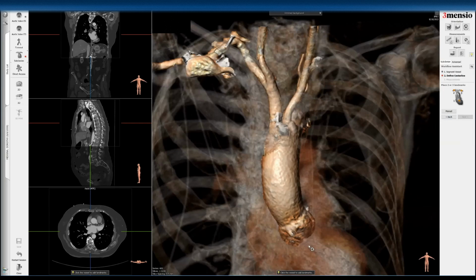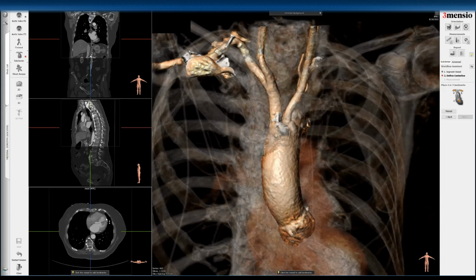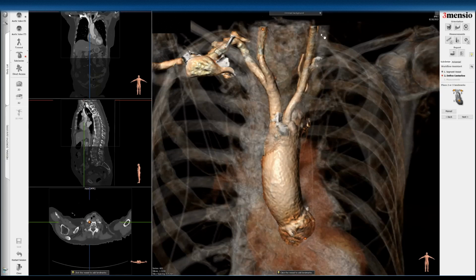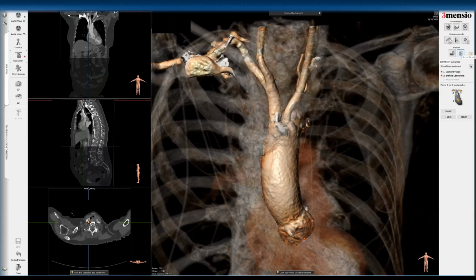I'm going to go from the aortic root. You can start from the aortic root, even the LVOT if you want, and then go all the way up to the carotid artery. Sometimes you might want to extend it. If we want to do a carotid access approach, we may go even higher, scanning the bottom part of the neck, so you can visualize the bifurcation of the common into the external and internal. But in the interest of time, we'll just do it here as is.